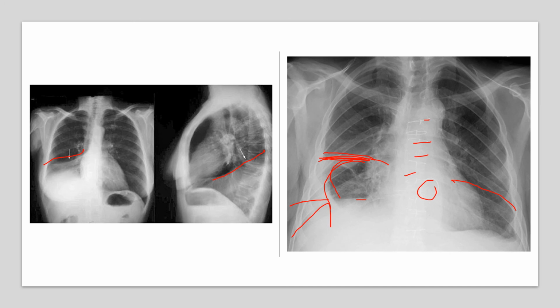If it's a little neonate and we see the fissure there, could it be something we could just do a small needle for their pneumo, right? So that's something that we'll be looking at. A, B, C, D, F.